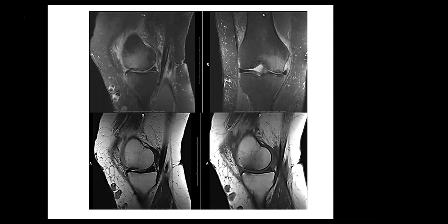This is not osteochondritis dissecans. This is subchondral insufficiency fracture. It used to be called SONC, spontaneous osteonecrosis of the knee, but they changed the terminology from SONC to SIF, subchondral insufficiency fracture. Now, how do you differentiate between osteochondritis dissecans and SIF?